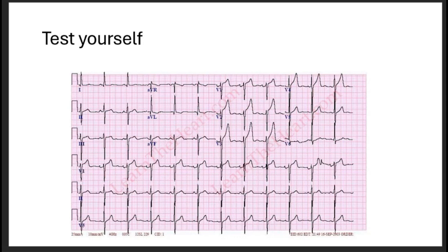If you look at the ECG, you can see that the QRS complexes are quite normal. They're less than 0.11 seconds basically, so you can calculate Sokolov's index normally. I don't think it's that prolonged. Could be, I'm not sure, but if you check here, you can see that there's a left axis deviation. Lead 1 is positive and lead 2 is negative, so this is left axis deviation.